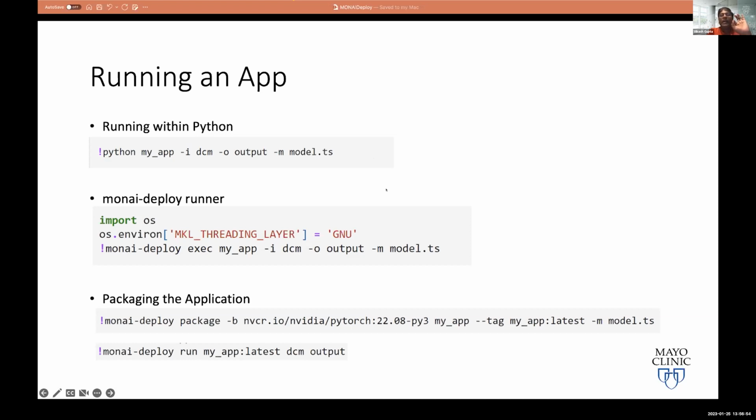And the triggering mechanism is something that you need to design the logic on. Is it like triggering the map based on when the image comes in? Is it an event-based trigger? All those things are more like orchestrator, but you can choose how to trigger it. And I will show you one example of it during my demo.